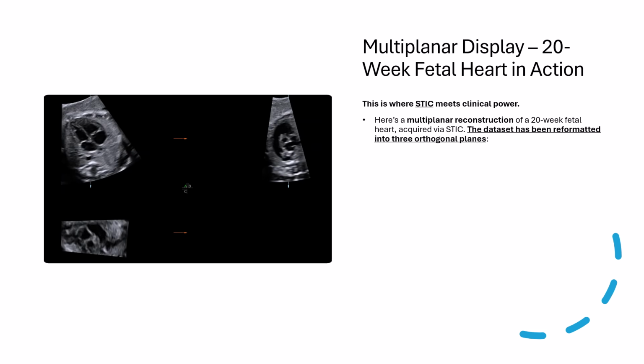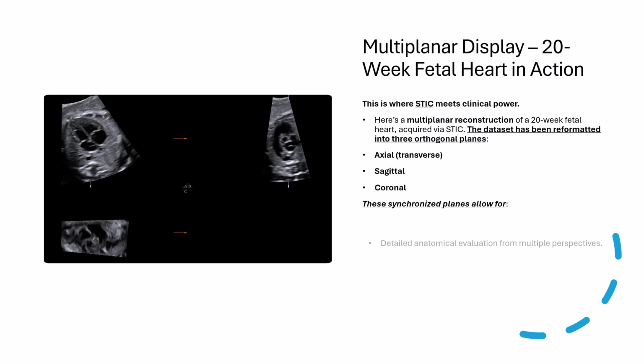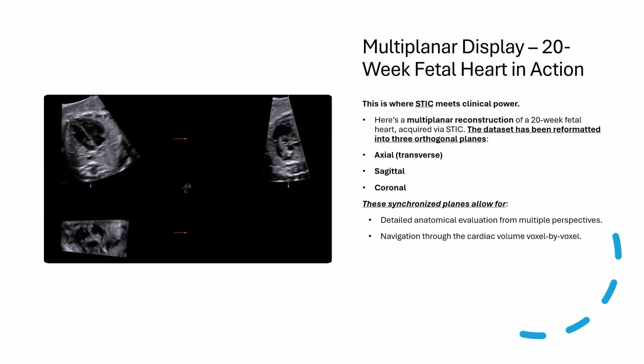The dataset has been reformatted into three orthogonal planes, A, B, and C, with plane A showing the axial plane, the sagittal plane in plane B, and the coronal plane in plane C. These three synchronized planes allow for comprehensive, detailed anatomical evaluation from multiple perspectives, with the ability to navigate through the cardiac volume, voxel by voxel.